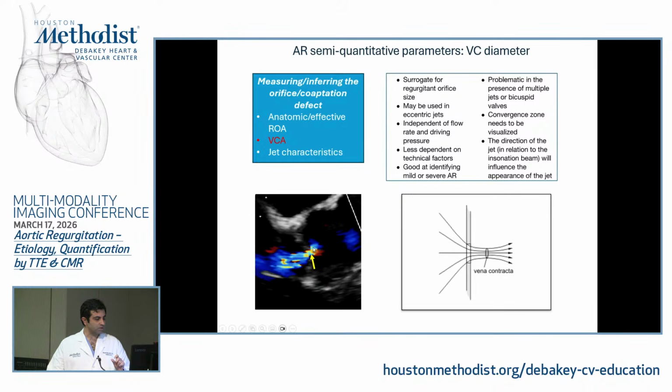Notice with AR in particular, the flow convergence has these kind of two heads. Notice the blue and the red. This is the flow convergence zone. If you look at it parallel to the actual ultrasound beam, you usually get a circle, right, for MR, etc. The reason is that with Doppler, when you have a phase shift that's perpendicular, remember that angle thing with the physics equation?